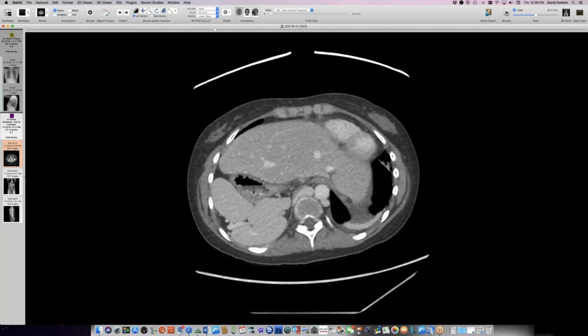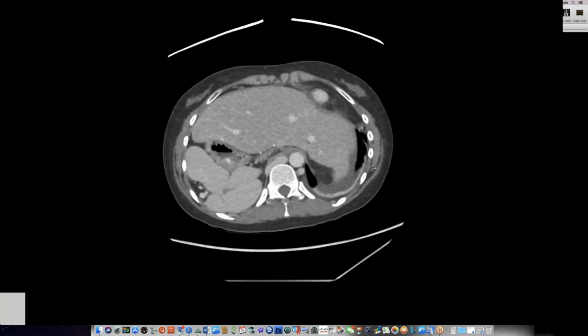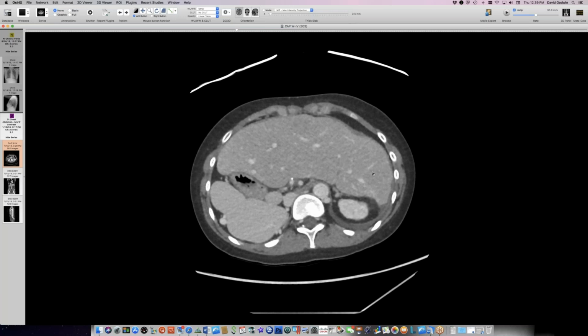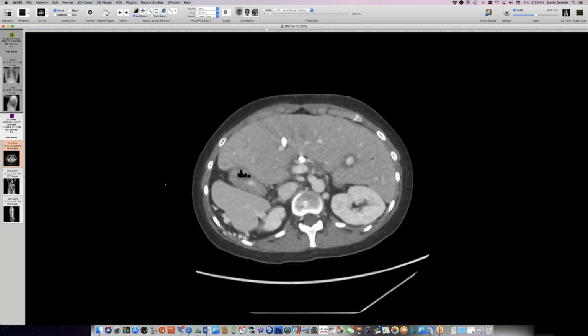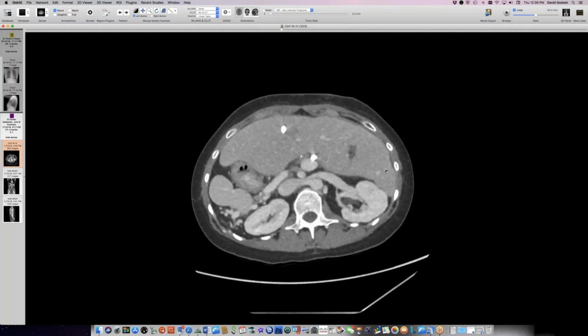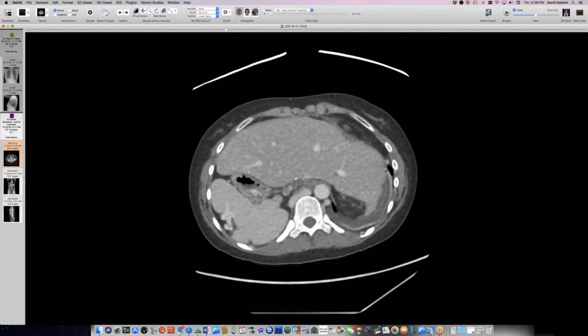inferior vena cava. Here's the stomach on the right, and notice the distribution of liver here. It's got a big component going way off to the left here, and there's no spleen that I could find. So this is asplenia, transverse lie of the liver here, azygous continuation. This person has some situs issues.